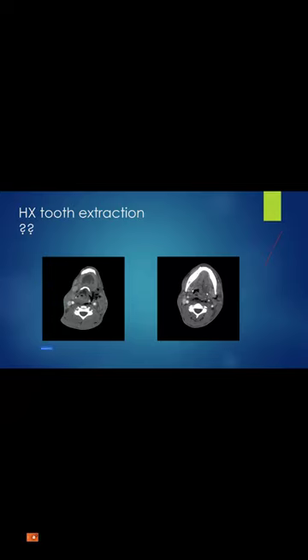Ludwig angina. Say it again. Emphysema. Yes, there is air. There is air in the soft tissue.